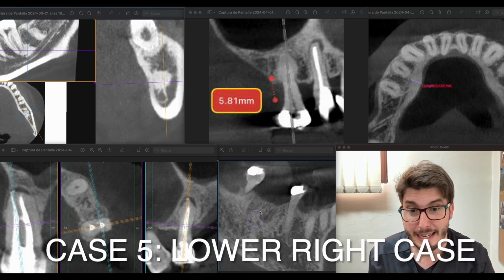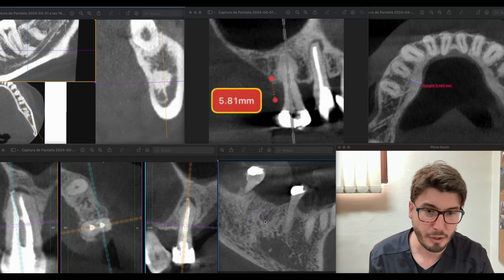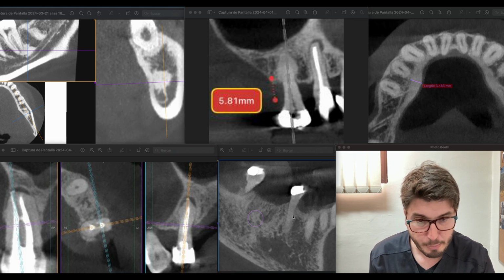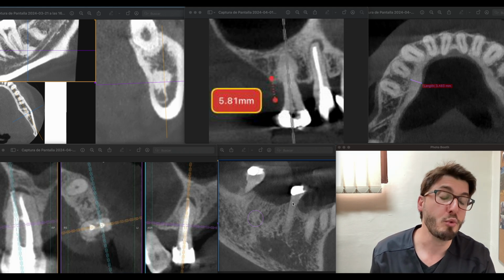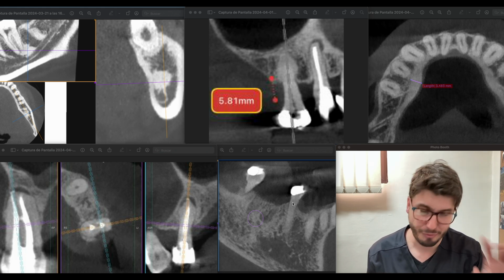And then the last case here, close to myself, is basically a case of condensing osteitis, right? This is an aspect of condensing osteitis. We are seeing this premolar here, and after the premolar, of course, there is a large metallic restoration as well. You would still do a vitality test and percussion test clinically, don't forget about this.